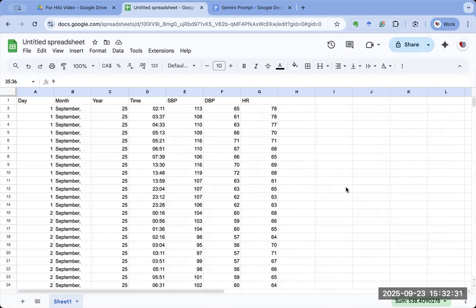Don't go by small variations over a few hours. Blood pressure is supposed to rise and fall. And that is the reason we talk about the time in target range. But the important fact is we still need to figure out whether, for long term health, the time in target range needs to be 90%, or 80% is good enough. That we will know over a period of time when we have more information and more research studies. I have a separate video on nighttime blood pressure and what it indicates.